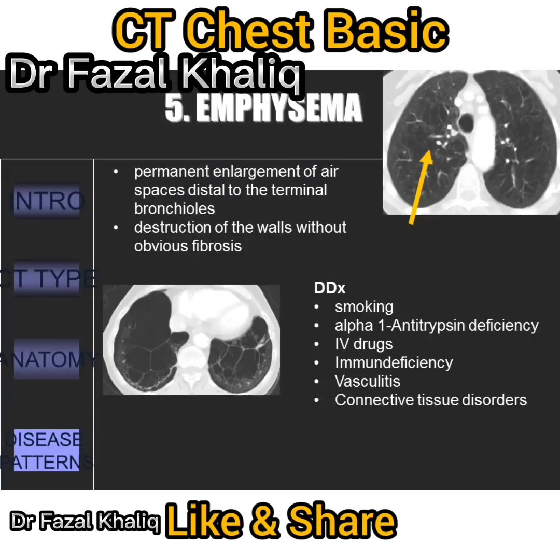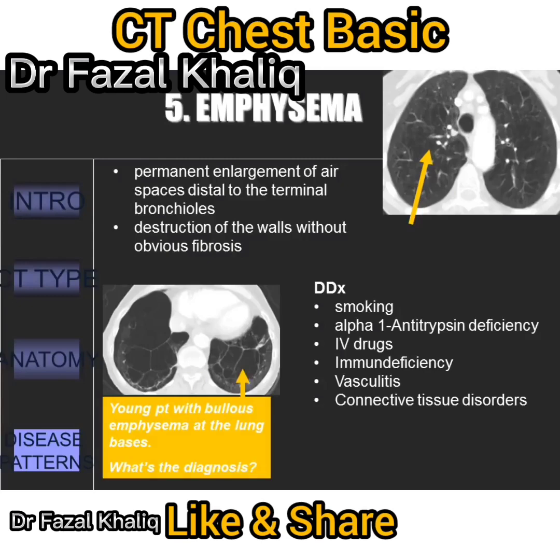High-res CT is more sensitive and highly specific for diagnosing emphysema than conventional radiography. However, the information gathered from CTs does not alter therapy, and thus CT scans are not part of the routine care of patients with COPD. I want you to look at this picture. This is a young patient with bullous emphysema at the lung bases. What do you think the diagnosis is?